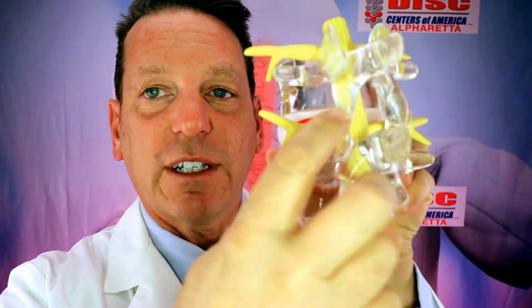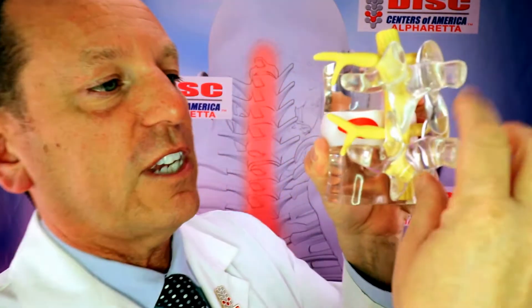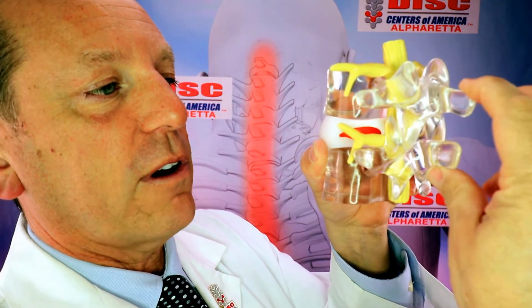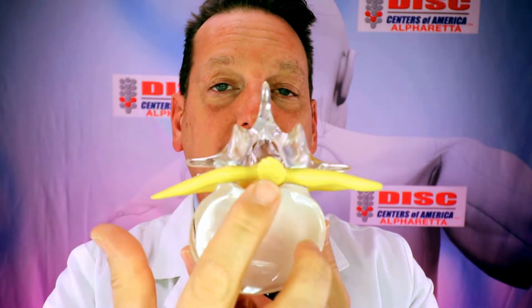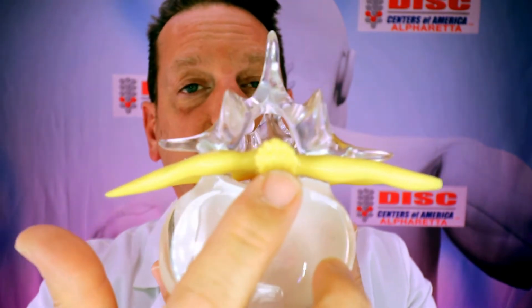The other thing you can see in the back is called the facet joints. These are the facet joints right here, and the facet joints are what actually allow the spinal column to glide and move with each other. And these are joints, and they are supposed to move. The other thing that you're going to look for is your spinal cord. The spinal cord is a long tail off of the base of the brain. It is the same type of tissue as your brain, so it is central nervous system tissue.